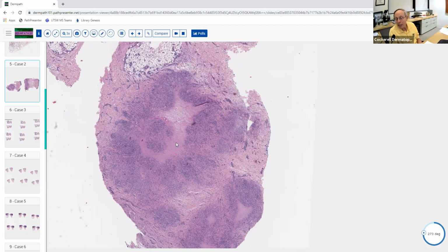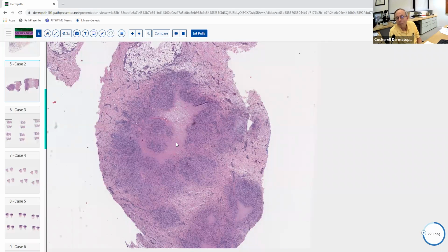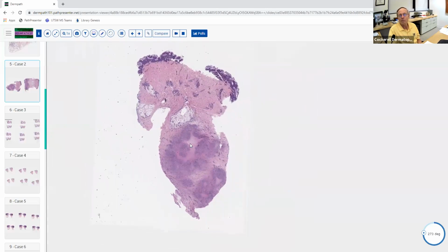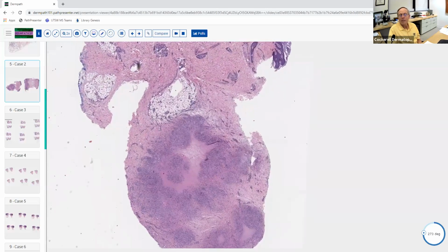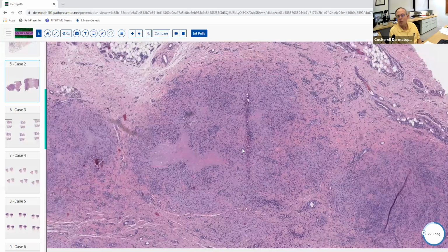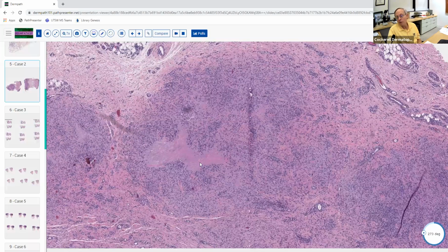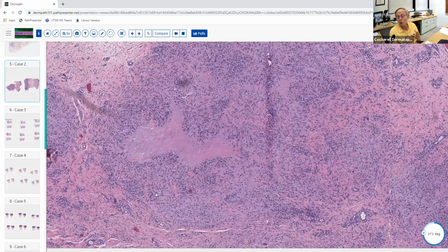Widespread disseminated GA, GA that's precipitated by sun. We call that actinic granuloma, but a lot of us today think that's probably just a variant of GA. So this is just one of the variants. This is the subcutaneous form. The one thing I'll just mention, the teaching point here, is that epithelioid sarcoma is one thing you have to remember in the differential diagnosis of palisaded granulomatous dermatitis. It's deep, and that doesn't give you mucin in the center of the palisade. It basically gives you tumor necrosis.